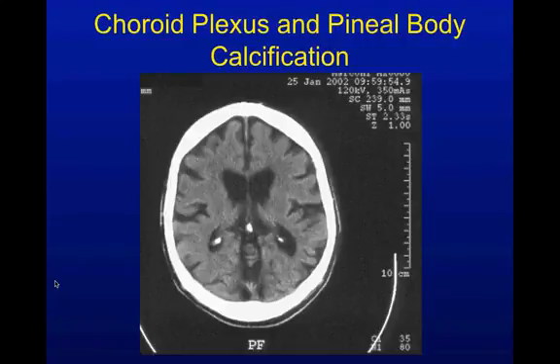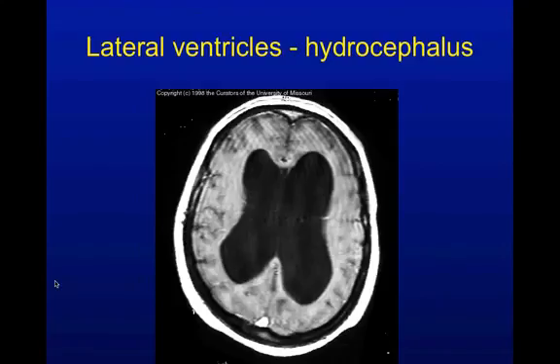Okay? And here's more calcification in the lateral ventricles as well as here in the pineal body. If you're not used to reading these on a regular basis, they're going to alarm you. I've seen some patients get transferred for those, and it's like, oh, you have normality, you can go home now. So just be aware that those are there. Fair amount of atrophy on that brain. Quite a bit of atrophy on this brain.